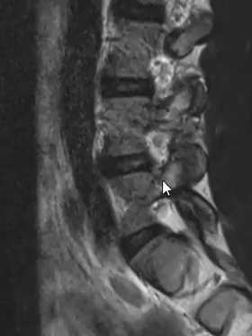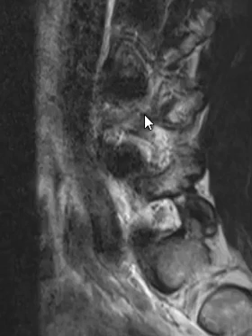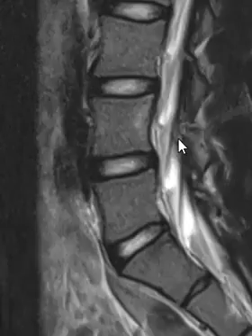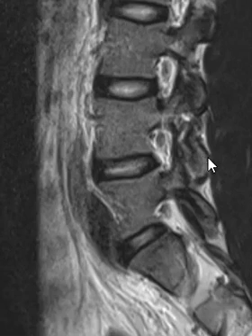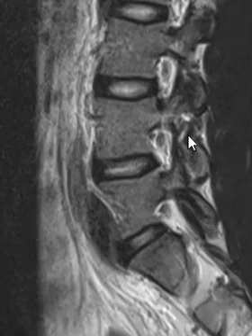Over here we can follow this bone through the pedicle and down. This is normal, but over here we go across, and then it looks like there is a little gap right here. Now if we go to the opposite side, this one shows up a touch better, but here's the pedicle going across, and it's supposed to shoot down here, and there's a little white line here that looks like it may be the pars defect. But again, very subtle findings.